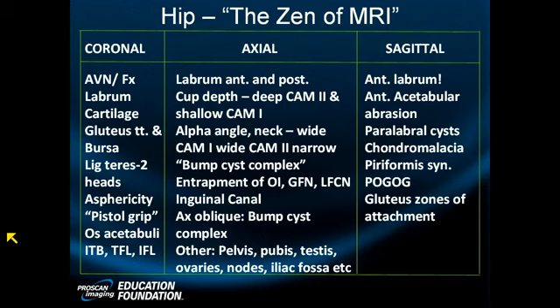They don't have to have a roof that slopes all the way up, grotesque, that you would see with the Ortolani maneuver at delivery. They can have low-grade forms of hip dysplasia that lead to other problems like cam impingement. Okay, so we've taken our broad view of the hip morphologically. We've looked at shape. We've looked at cup acetabular conformity and acetabular coverage. We might even hallucinate a little cleft right here, but that might be premature. Let's keep going, shall we?